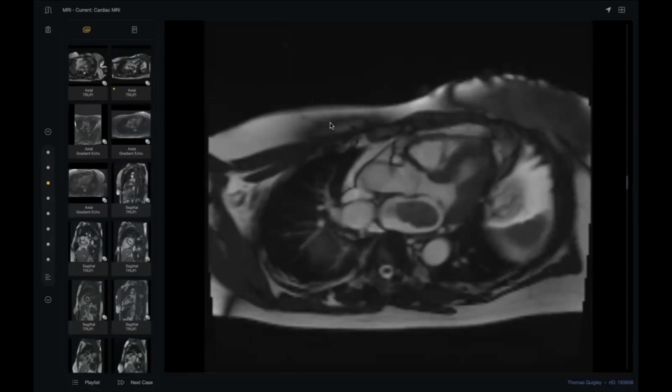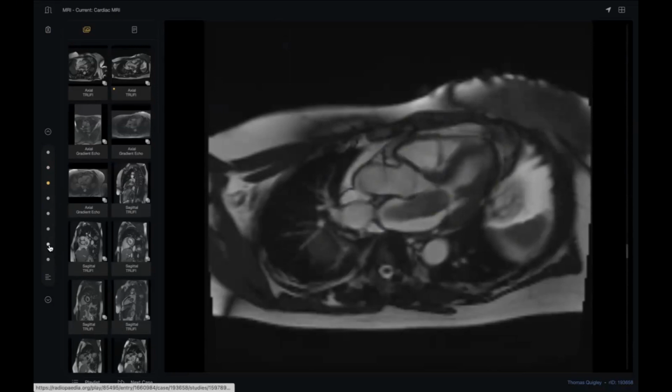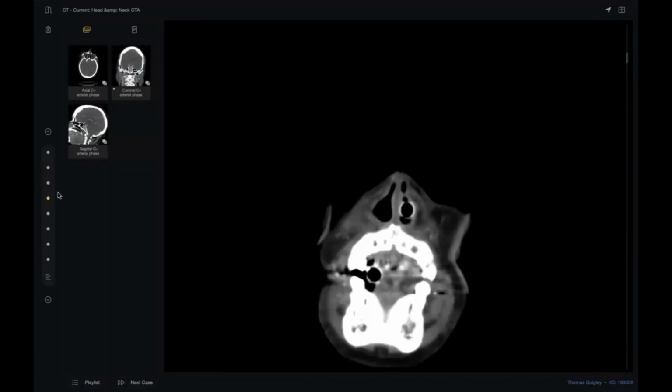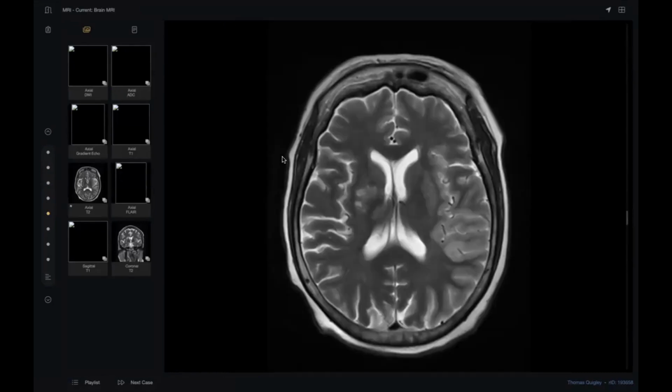Okay, this is an MRI, cardiac MR. Okay, dynamic study. The filling defect is protruding through the valve into the left ventricle. I can see faint enhancement inside. I would suggest it could be a tumoral thrombus. Okay. What happened here?